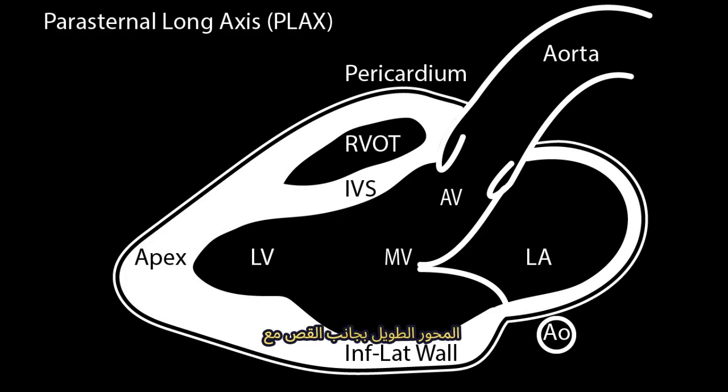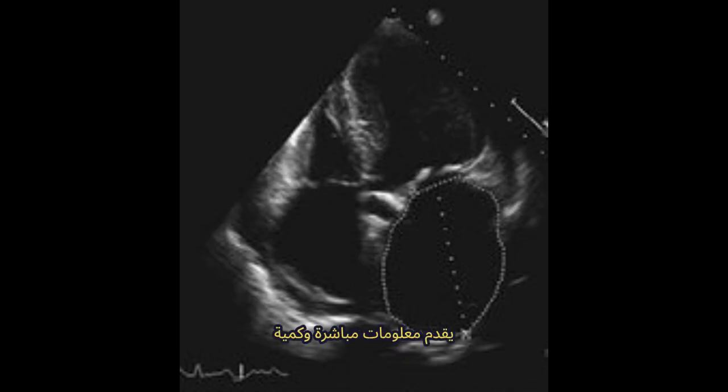Echocardiographic signs of left atrial enlargement: parasternal long axis echo view with measurement overlay. Echocardiography provides a direct and quantitative assessment of the left atrium. Linear anteroposterior dimension of the left atrium is measured in the parasternal long axis view.